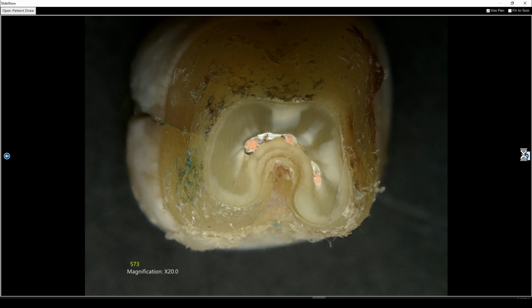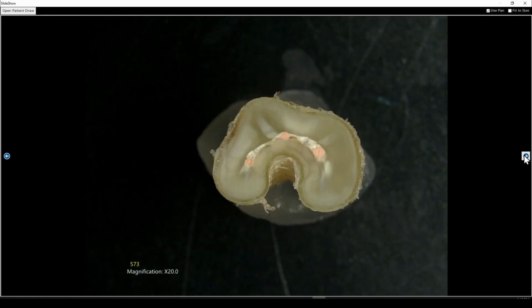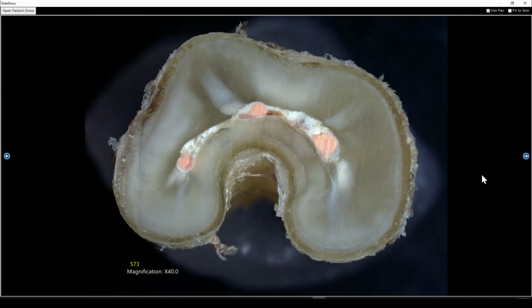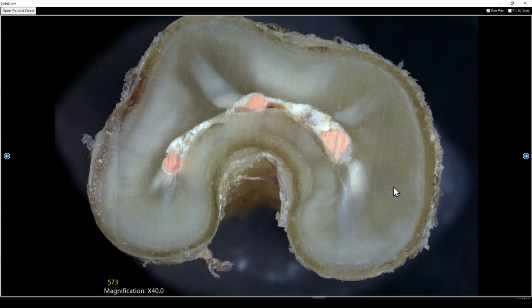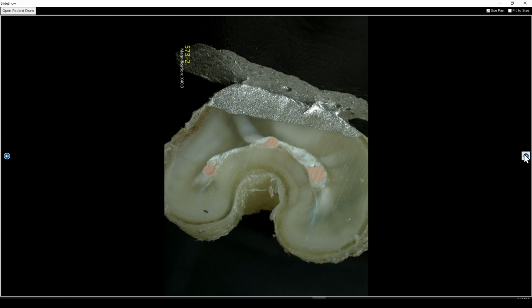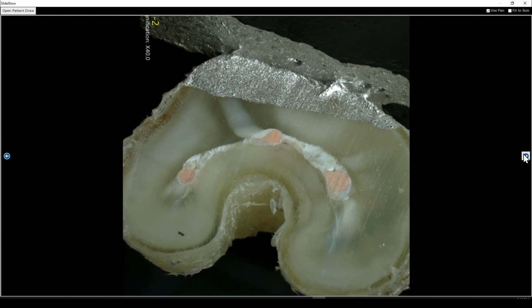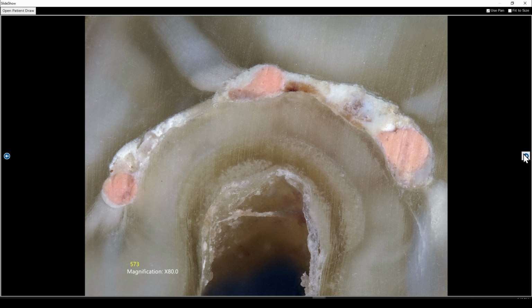We cut the apex off just so we could get a sense of how well it was obturated in the C-shaped canal. And it looked like the GentleWave did a pretty good job of removing all the tissue. It was filled with sealer. We used BC sealer here and the gutta percha. And there weren't any obvious voids. It looked to be completely obturated throughout its length.